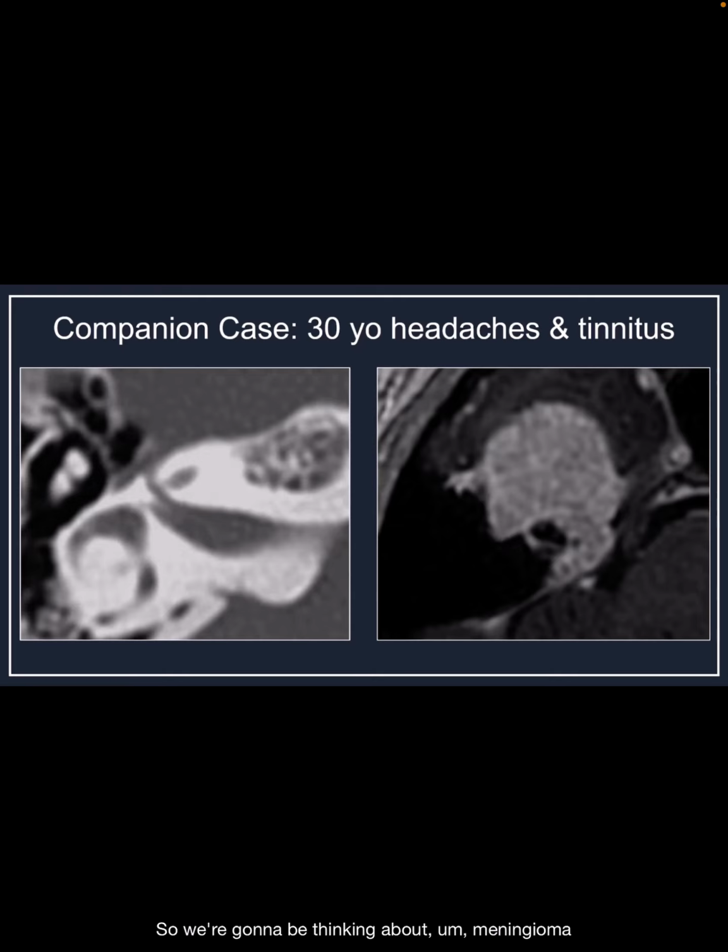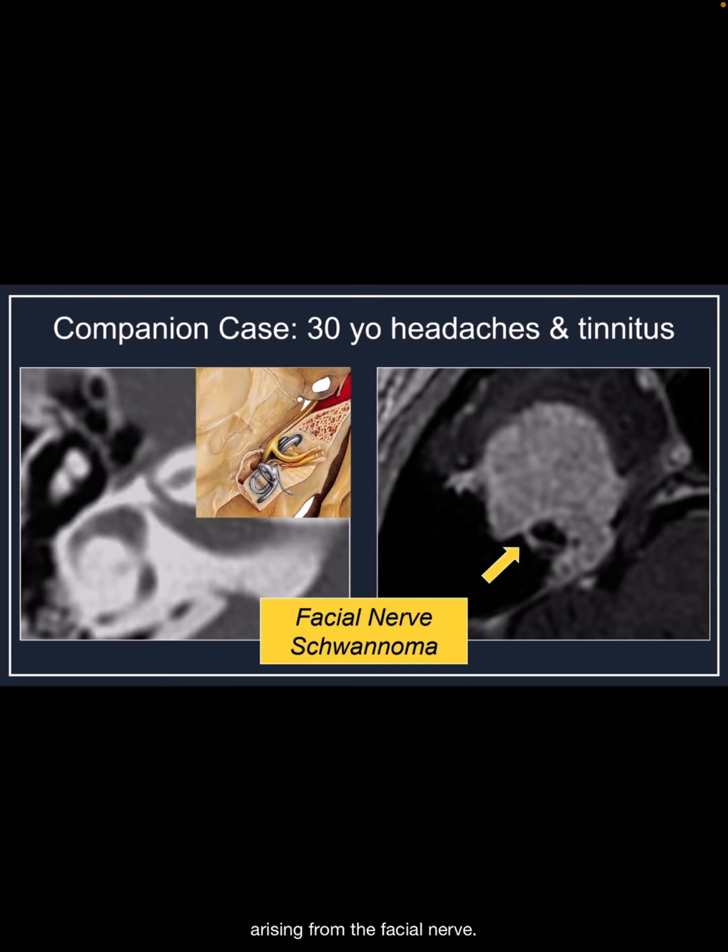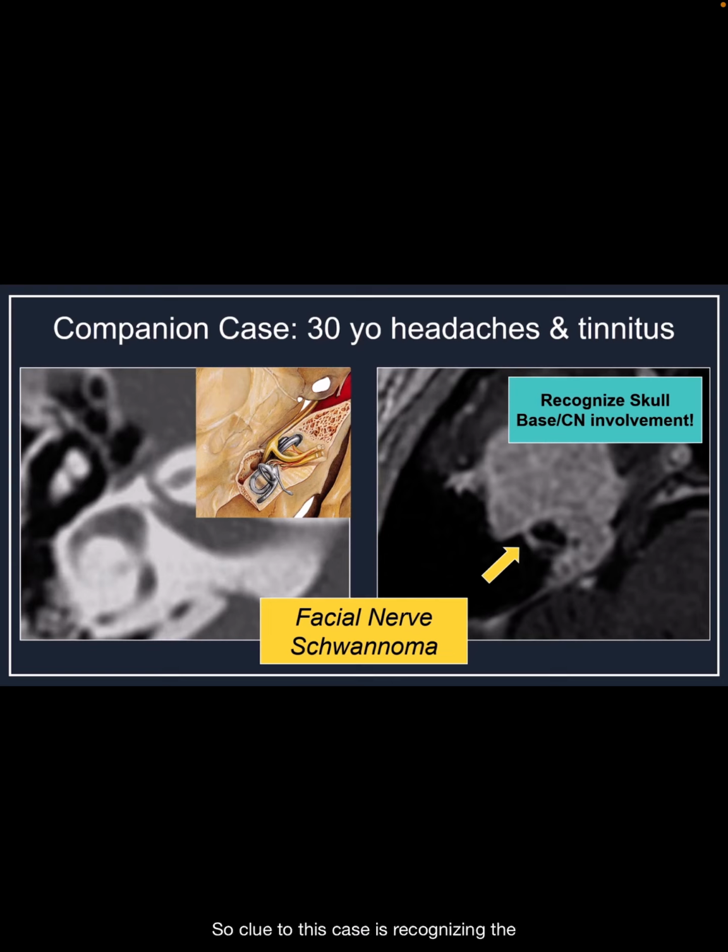So we're going to be thinking about meningioma or potentially schwannoma in this case, and this turned out to be a schwannoma arising from the facial nerve. So the clue to this case is recognizing the skull base involvement.